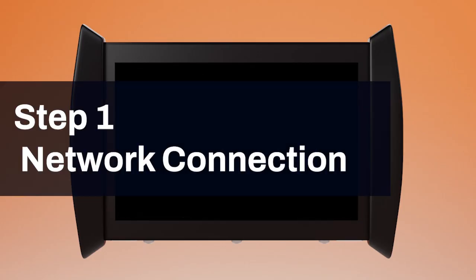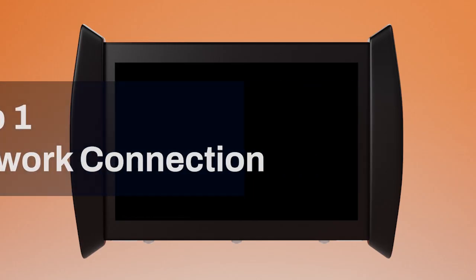Before starting, make sure your Screeni is connected to the hospital network. If your monitor has a LAN port, plug in the Ethernet cable directly. Otherwise, use a USB to LAN adapter to connect the cable.